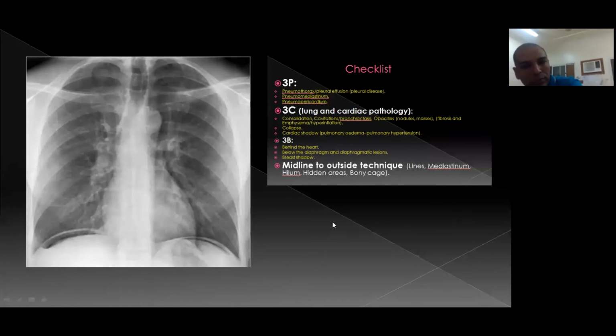Dr. Talat, although the chest X-ray is the graveyard of radiology, I think I can pick the diagnosis. There is gas under the right side of the diaphragm, most likely perforated viscus.